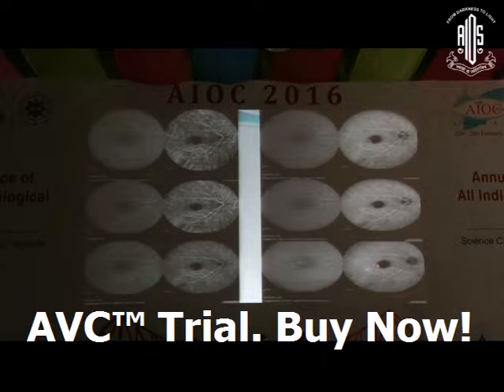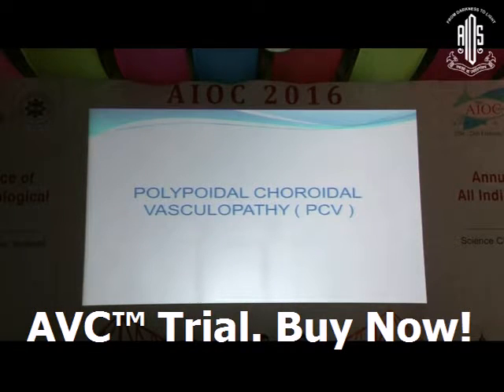So most probably there is a fibrous element in this PED at the tip of the PED, and there is also a notching here. So meaning thereby, if you have a notch and a hot spot, this is a fibrovascular PED, and these patients we diagnose as wet age-related macular degeneration and will require VEGF inhibition.